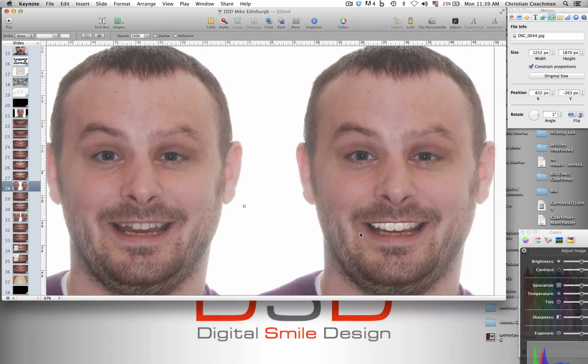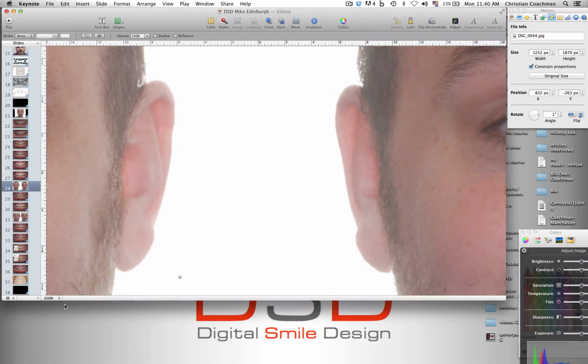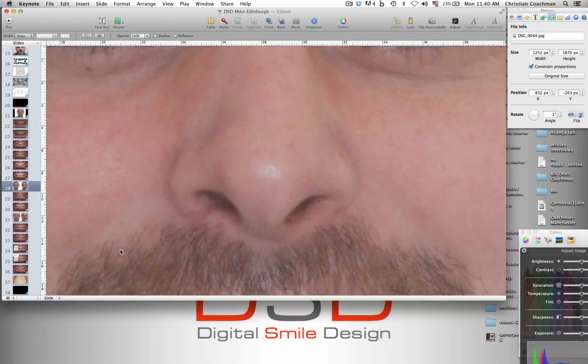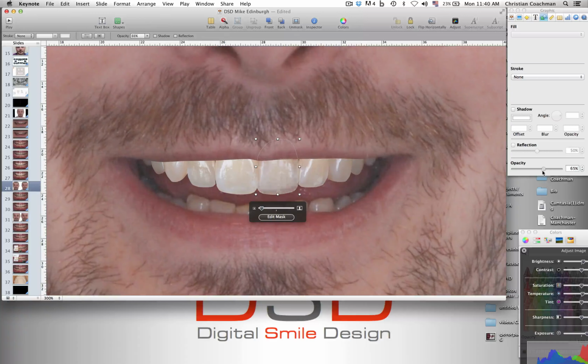And then if you change the positions, for example, I can then zoom in, put some transparency, calibrate my ruler, and measure again. Remeasure what is happening here. For example, what's happening with the cuspids.